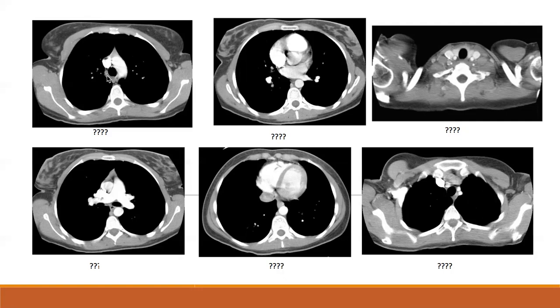Okay, moving downwards just a little bit more, we are going to be right above the heart. We're going to be hitting all of those vessels that are just above the level of the heart, which are your pulmonary arteries, left and right. You remember that your right pulmonary artery is passing anterior to its respective bronchus, and the left, if you imagine the bronchus sort of going this way, is going to be superior to its respective bronchus, right? And then once again, you have the superior vena cava and the aortic arch.